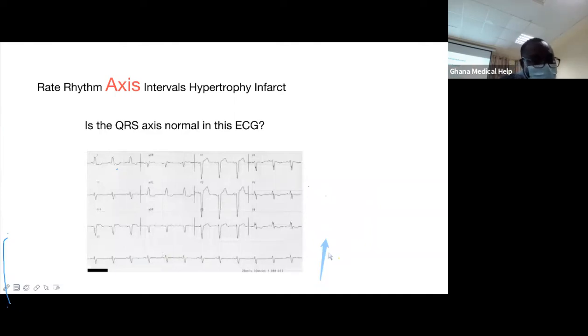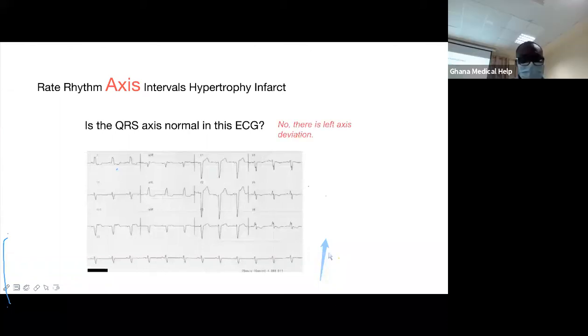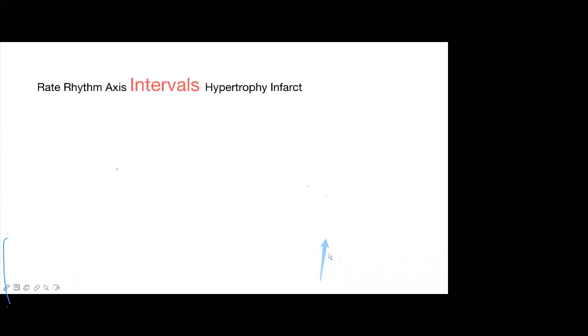If you combine what we have just said, anyone can answer. Just unmute yourself and answer, then we'll move on. Okay, in-house people, normal, abnormal, left or right axis? Left axis. Left. Okay, left axis deviation. So we'll move on. Great.